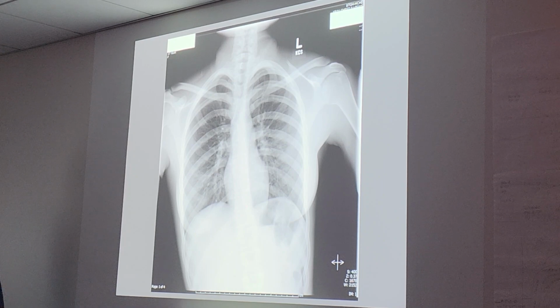So is the right or left side elongated? Which side do you think looks more elongated? It's very slight, but I'm thinking the left side's elongated. See, I think if the spinous process is going to the right, then that means the left should be long. Yeah, that seems to be the case. The left is also slightly more. And also, if you look at the clavicle, it's more open on the left side.